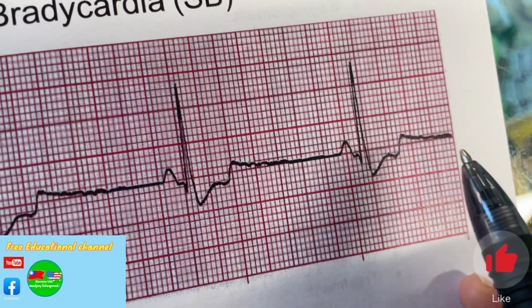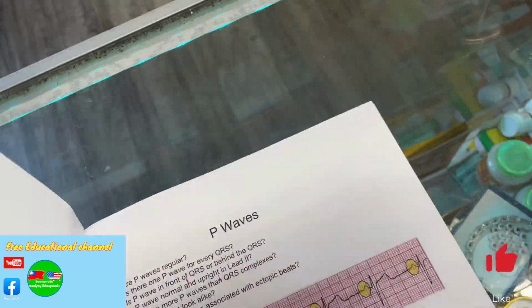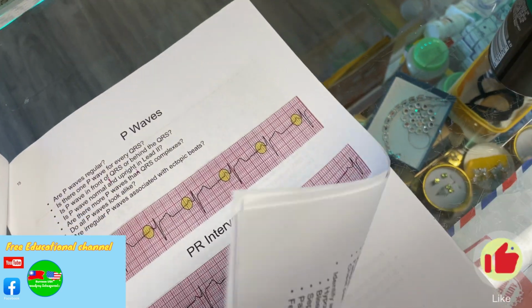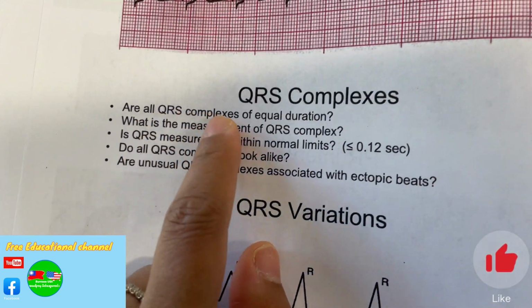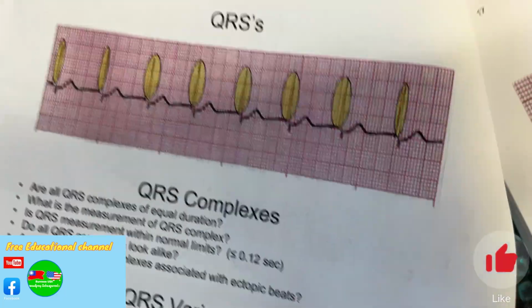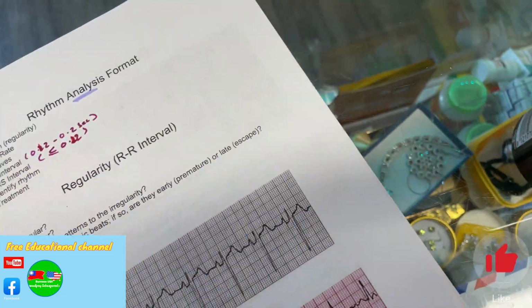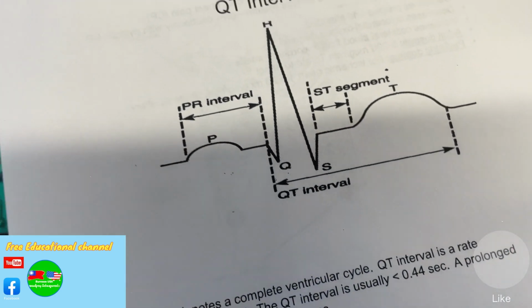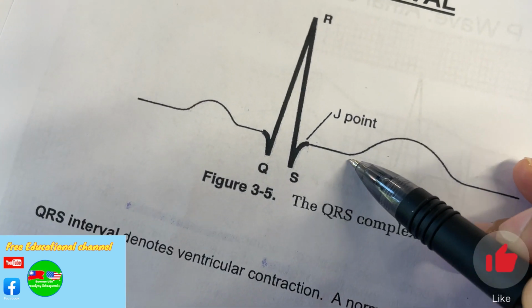Okay, let me check this QRS interval real quick. I want to make sure this QRS is less than 0.12. Okay, good. It doesn't come up until here.